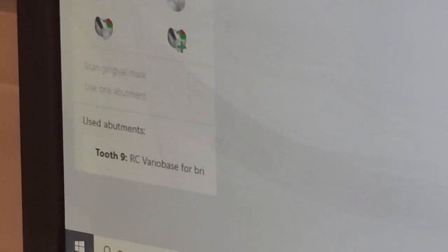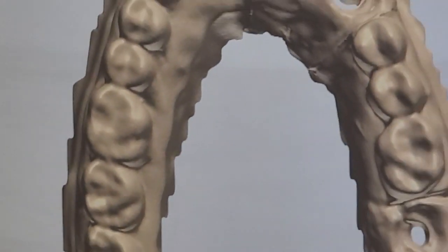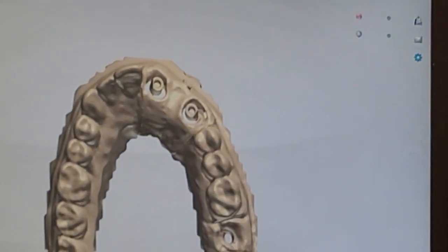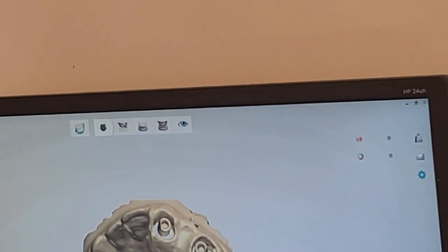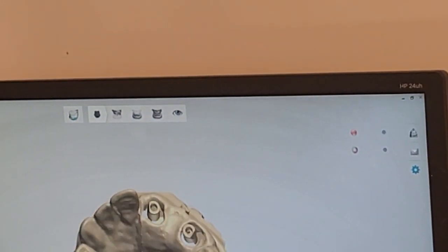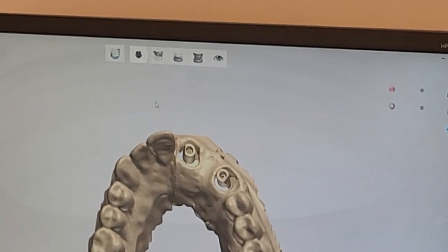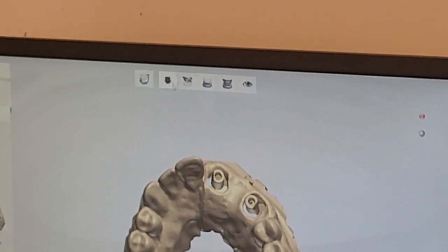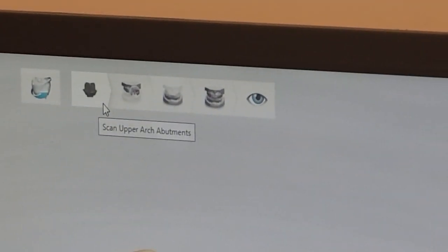Let's say I realize that the way I put the order is not correct. I can go back to the order by clicking here and modify the order. All right. But always check here. So every step you do, if the step is done correctly, next to this window here, you should have a green check mark. That means everything looks good.